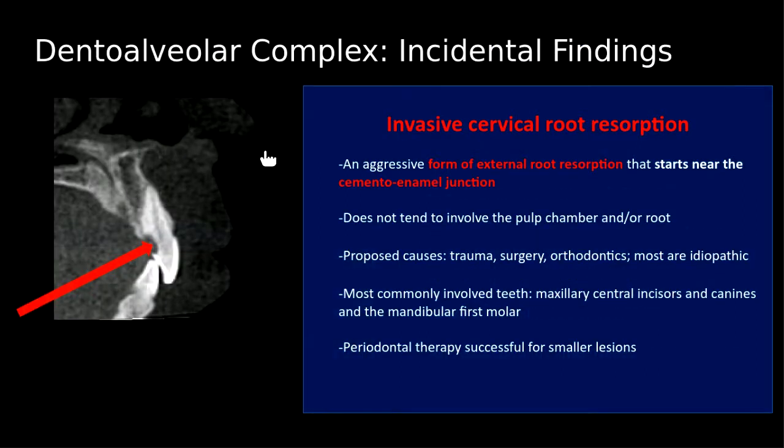And there's another finding you can see. You can also see the root resorption. This is very interesting root resorption. You can actually see it in the cervical area, but it's not going all the way into the canal. It just stops there before the root canal.